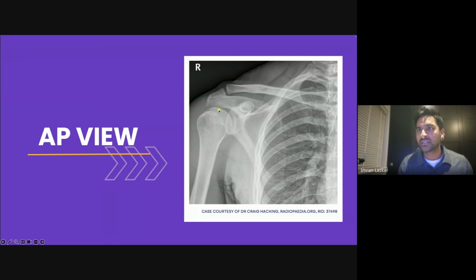So we've looked at the humeral head. That's the humeral head. And what you want to do is make sure it aligns nicely with the glenoid. Now think about the humeral head and the glenoid, like I said before, with regards to the hip versus the shoulder. The hip is a really pincer sort of joint. What I mean by that, you've got your femoral head, which is your leg, and it goes into the acetabulum, which is the ball socket, and it really covers the whole thing right around like this. It's very hard to dislocate. You need a really big impact to do that.